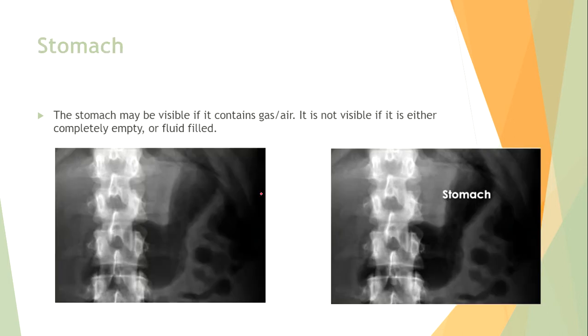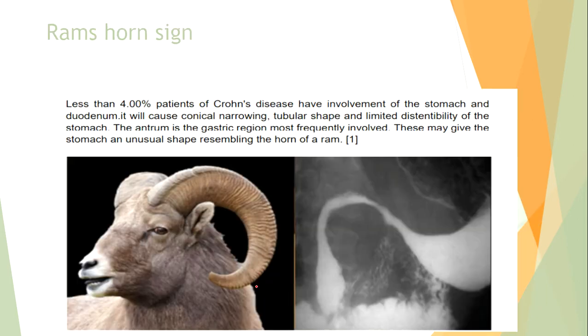Stomach. The stomach may be visible if it contains gas or air. It is not visible if it is either completely empty or fluid filled. So this is the stomach. Ram's horn sign.